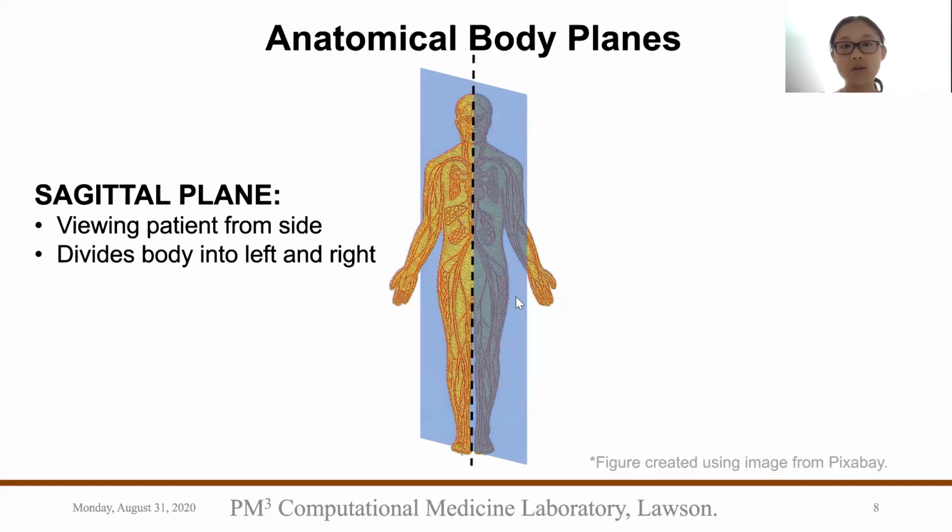So hopefully this quick overview helped us become a little bit more familiar with the planes and the display screens on SimVascular. We'll head back to the SimVascular application and continue by talking about a tool used for viewing images called volume visualization.